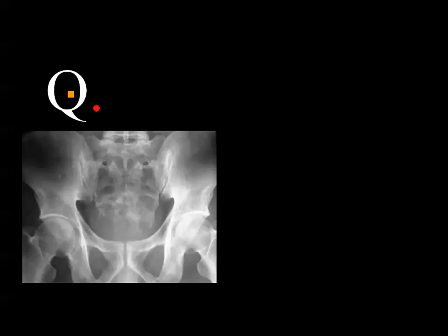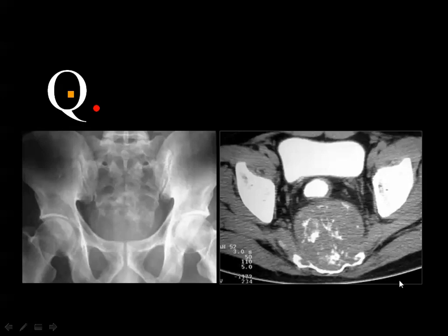X-ray of the pelvis. Sacral lesion, and you see the destructive changes in the distal part of the sacrum with an appearance of a soft tissue mass. This is a CT scan showing a mass with internal calcification eroding the sacrum. Chordoma, this is the classic site and appearance of sacral chordoma, midline lesion with some destructive changes and matrix calcification.